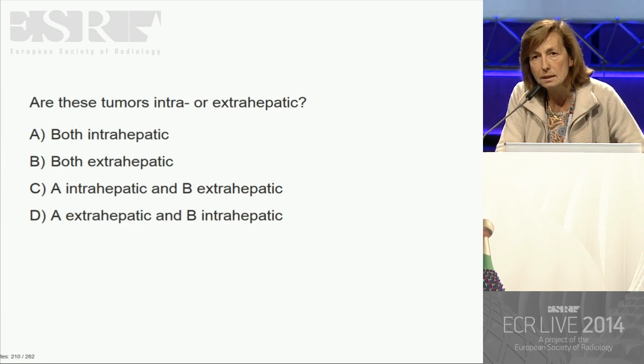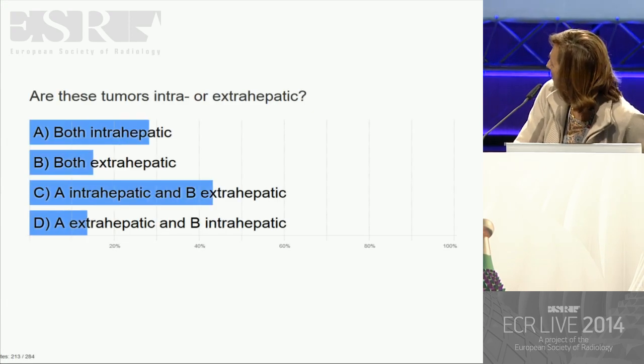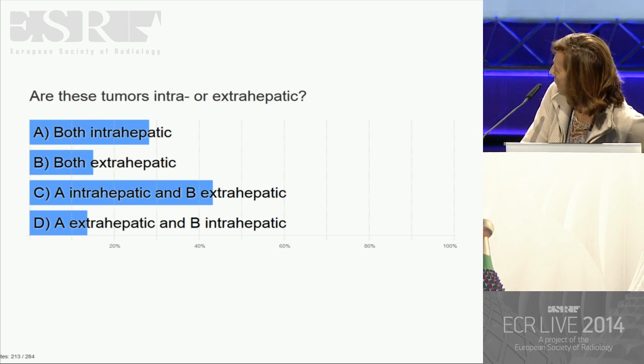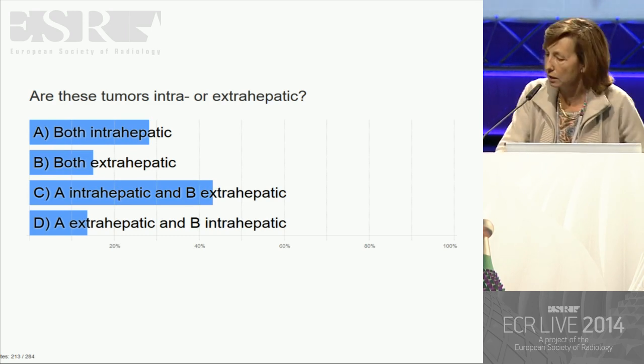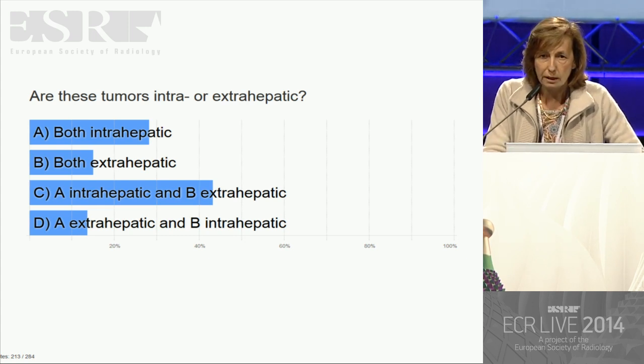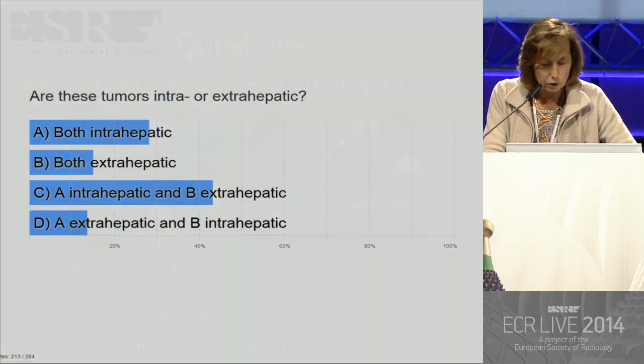Thank you. Let's see the answers now. Okay. So still, I would say many different opinions. Maybe you have favored A is intrahepatic and B is extrahepatic. Unfortunately, the right answer, and I will explain, both are extrahepatic.